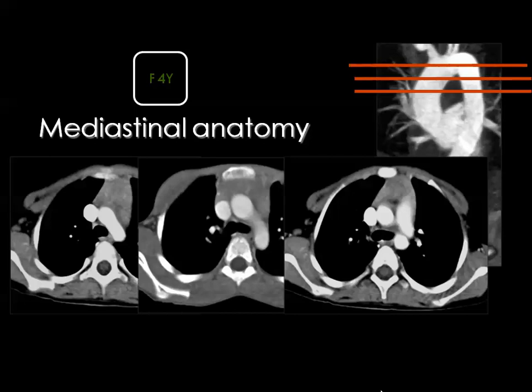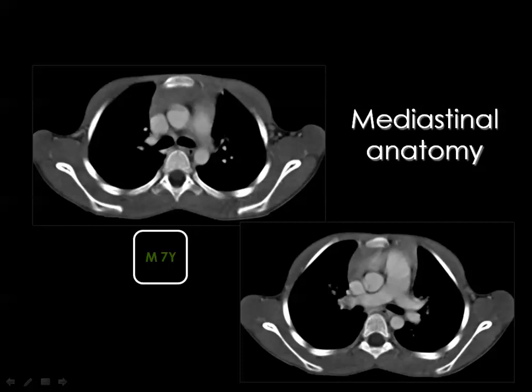the cardiac chambers. Then if you look here, this is the superior vena cava, ascending aorta, descending aorta, and this is the site of the pulmonary artery, part of the thymic gland. Then the pulmonary artery looks like an inverted V, and this is the main trunk, and this is the left branch, and this is the right branch.